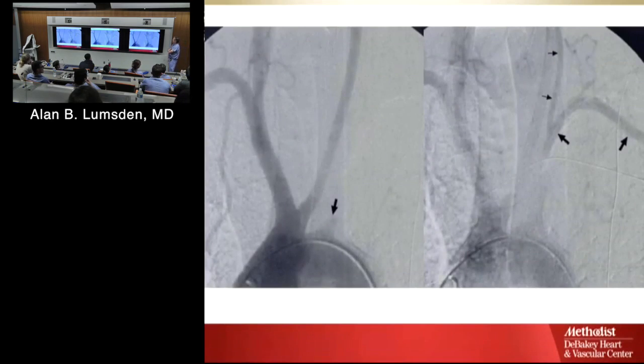Okay, so this one's a little more complicated, but let's talk through this. Catheter in the aortic arch. Aortic arch injection, okay? What do you call this? Bovine origin. Arrow's a clue. An occluded left subclavian. This is the same patient, okay? With more clues. Arrows are usually clues, but sometimes they're misdirection, so you never really know.